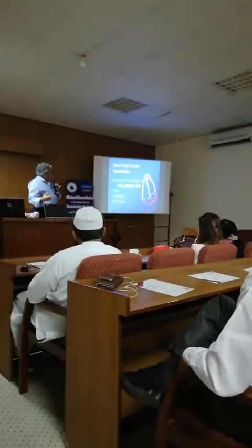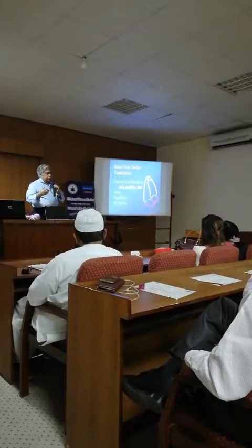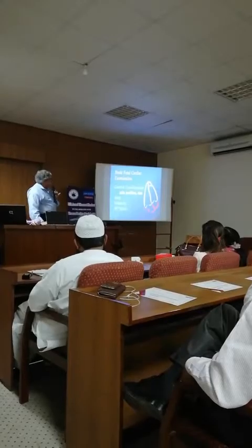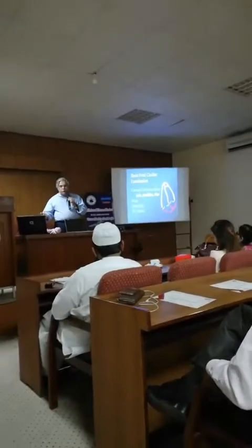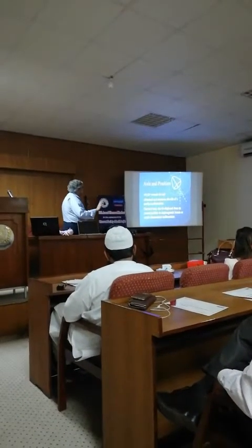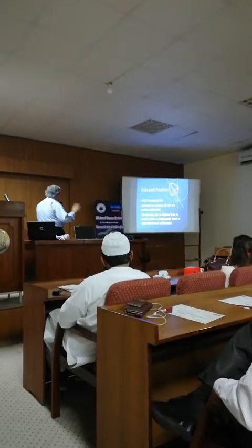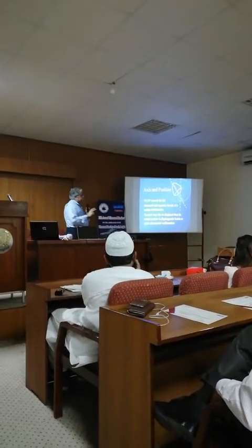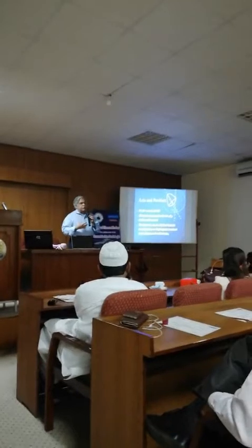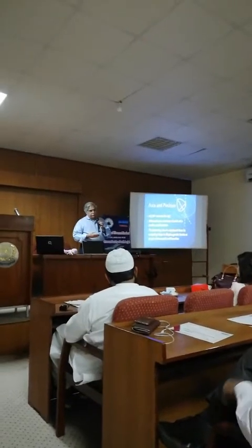Where is the heart? Where is it pointed? And how big is the heart? Okay, axis and position. The heart points to the left. Most of it is midline, but the apex is pointing to the left.